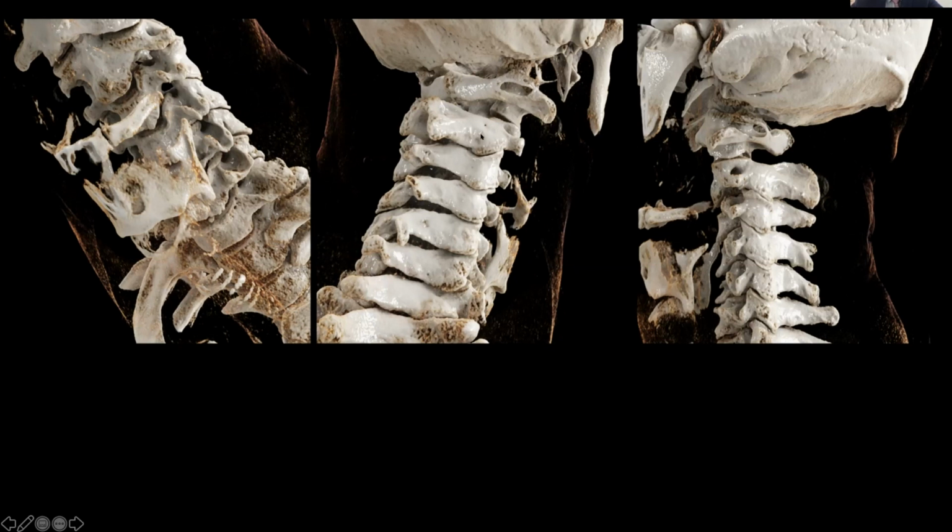You can see, and this is an important anatomic detail, that the C2-C3 facet joint is orientated more medially than the remainder of the facet joints. Biomechanically, we talk about C2-C3 as being the root of the cervical spine, because of its ability to maintain that lock between the atlantoaxial joints above and the column of the spine below, and not being able to tilt out laterally is part of that.